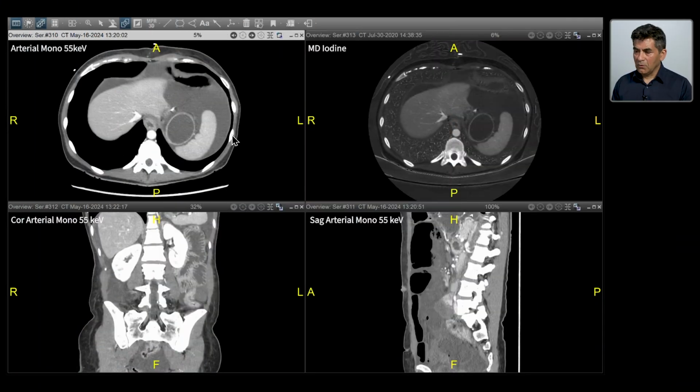This is the hanging protocol I prefer in patients with high risk or suspicion for bowel ischemia. One thing to keep in mind is these patients often present themselves in the emergency setting, and you don't have much time. You have to provide that information to referring physicians for presence or absence of bowel ischemia because a lot hinges on the information we provide. This is a time-sensitive diagnosis. So first, I will show the hanging protocols.